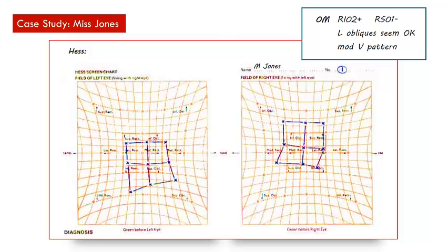So what we can see, if we take the horizontal deviation here, the patient has no horizontal deviation in direct elevation, and then there's a slight eso by less than 5 degrees, which is not a difference of greater than 15 prism diopters. Okay, so again, if we assess the patient in the 30-degree outer field, in this instance we may have found that they do actually have a V pattern.